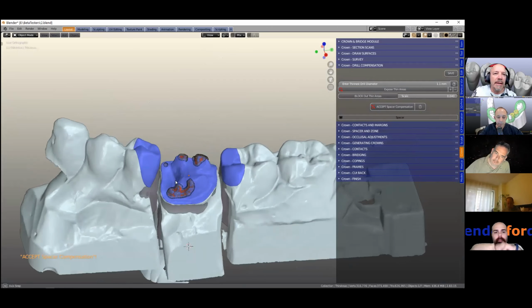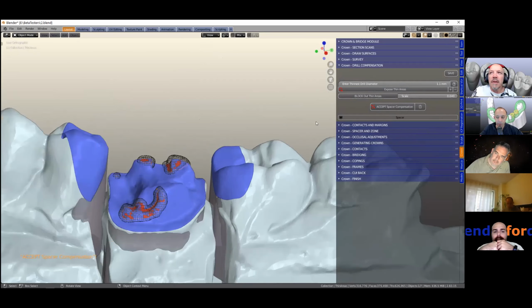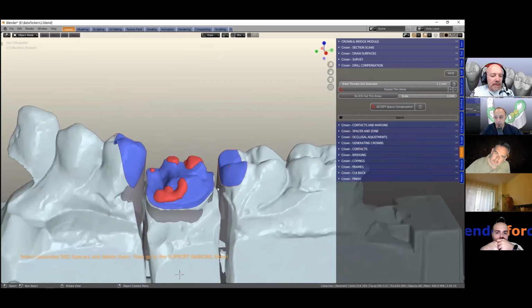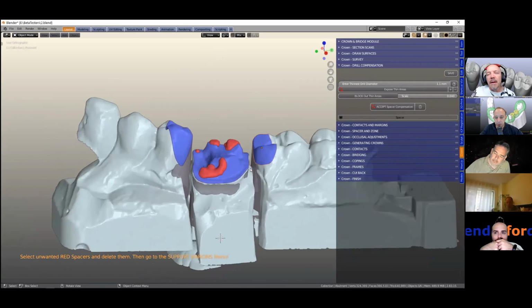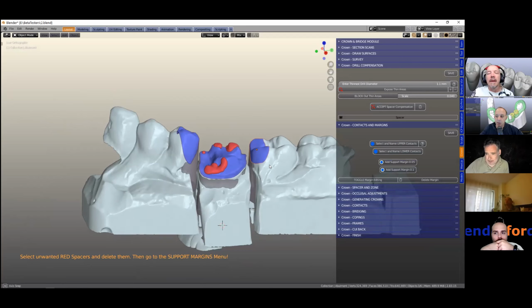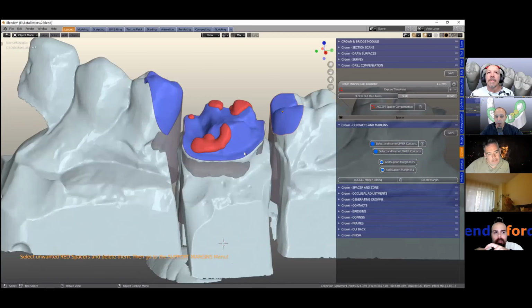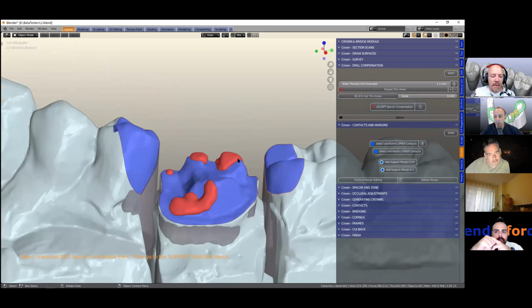Okay, so this brings in a mesh structure, and we're going to accept that. All right, as you said, Wolfgang, we've blocked it out like we would do in the lab. Just to get you right, Michael, that 1.1 is a measure on the upper surface, isn't it? So that the burr can actually go all the way in there.